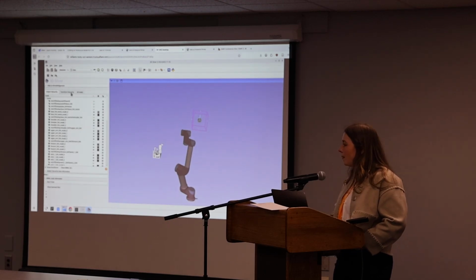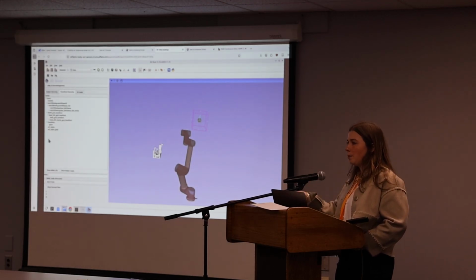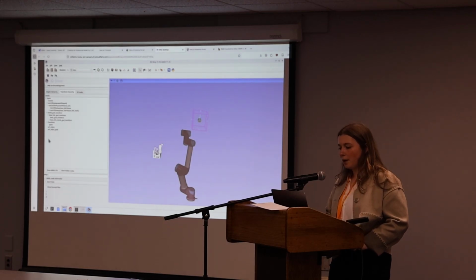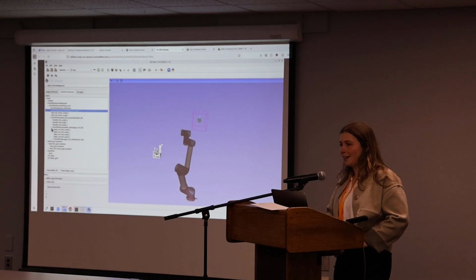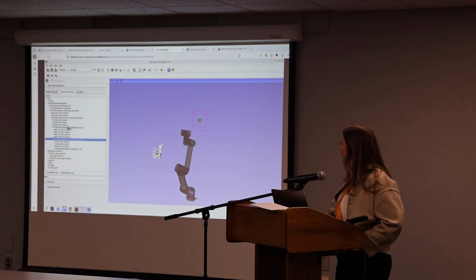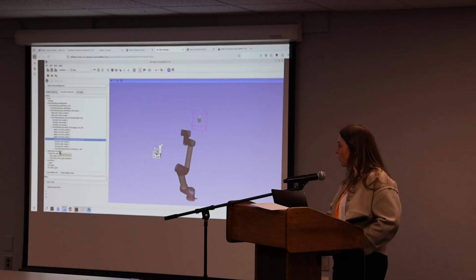Okay, and then if we switch to the data module, here you're going to switch to the transform hierarchy tab, and we're going to add end effectors to both our goal state robot and our typical robot. Again, this is something you would probably program into your URDF file, but just for the UR example, we don't have one by default. And I actually generated this STL of an end effector just with Claude. I asked it for an end effector of the UR5, and it gave me something in one prompt. So you should use Claude. But you can extend the tree. So this first one that we're looking at is the actual robot, and then this one below is the goal robot.